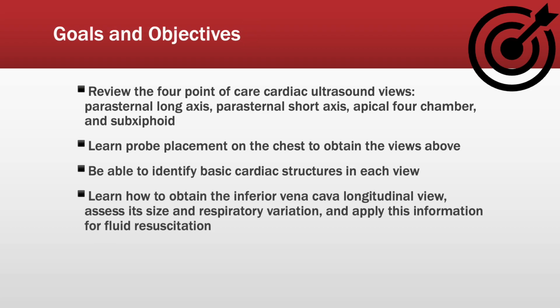Our goals for today are to review the 4 point-of-care cardiac ultrasound views, which are the parasternal long axis, parasternal short axis, apical 4-chamber, and Subxiphoid views. We also want to learn the proper placement of the ultrasound transducer on the chest to obtain the aforementioned views. Be able to identify various structures in each view.